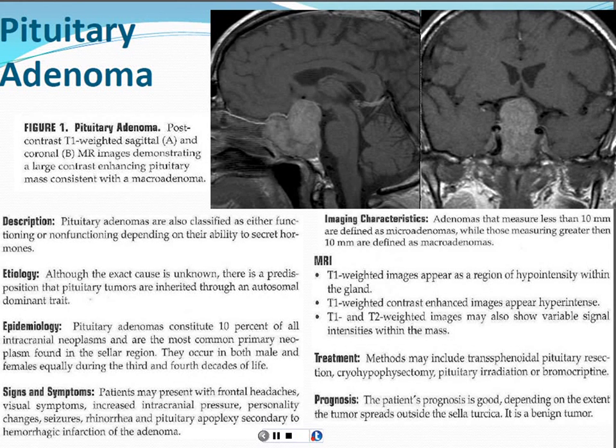The other thing is there's also a lesion called a pituitary microadenoma. It's just an arbitrary term for whether it's big or small, just like micro and macro, like you would expect. Sometimes these lesions are really, really small, and they just show up as an area of slightly less enhancement than the rest of the pituitary gland. When you're doing a specific pituitary mass protocol MRI, you'll take usually 3 different planes, thin section imaging, and sometimes more than one time point, just to see if there's any differential enhancement of the gland.